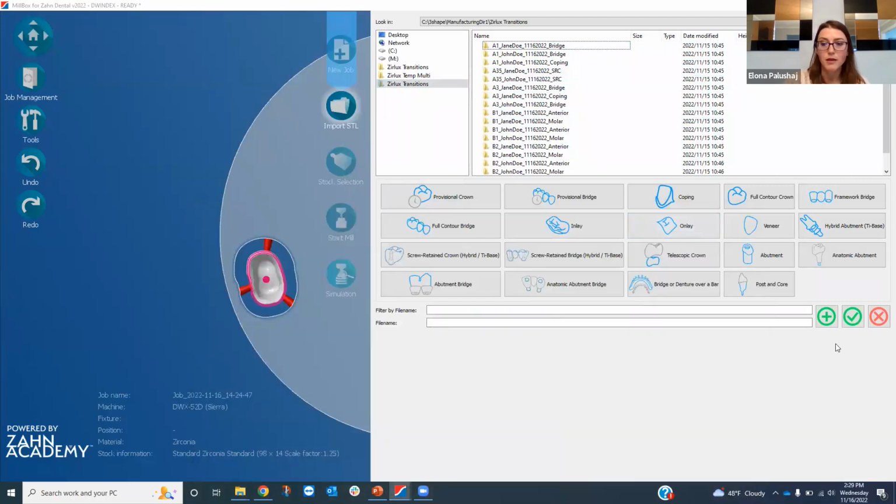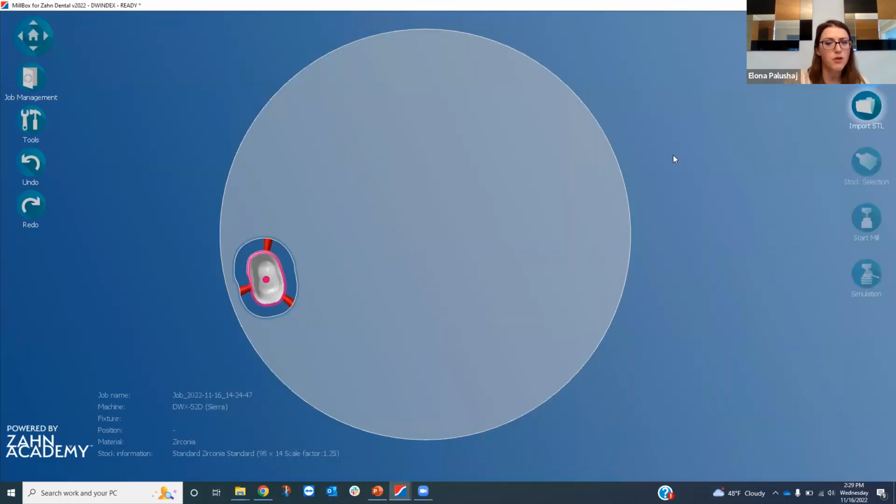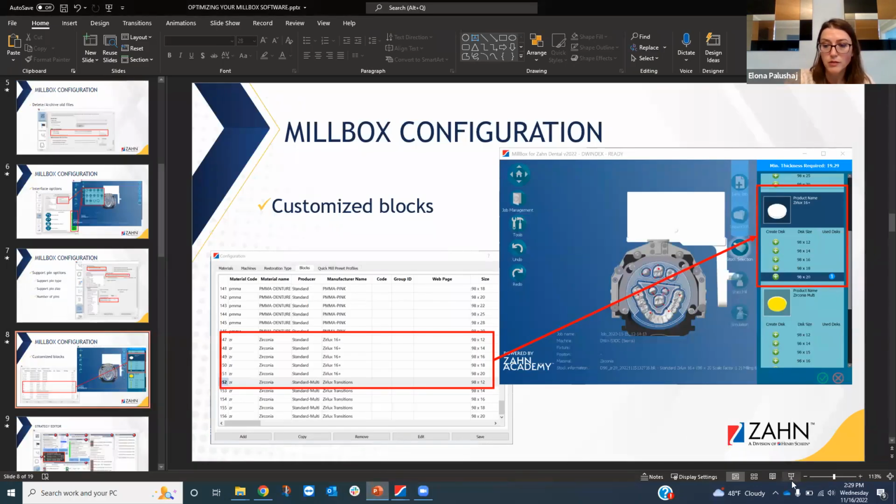All right. So that was all as far as configuration goes. We'll jump into strategy editor and go over what strategy editor is and what it can cover.